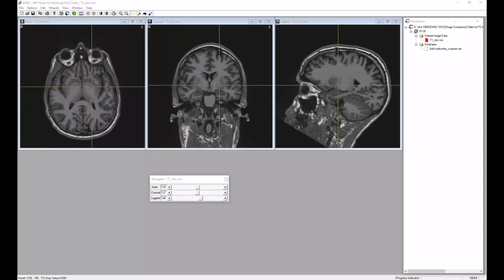The thing that FreeSurfer does not give is the skull. And this is a T1 weighted image, and as you know, although we might imagine we can see the skull here, really we don't see the skull. In order to get the skull, ideally you would need CT, but that's ionizing radiation. So what do we do?